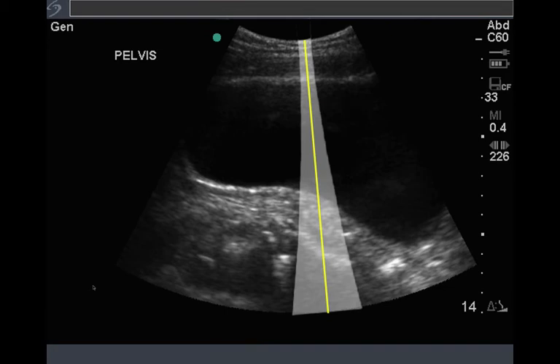So this is a very full bladder, and here the ultrasound machine assumes that the ultrasound beam is a thin line down and all echoes will return from inside that line. But actually the ultrasound beam is thicker, and some of the echoes that return to the ultrasound machine are actually returning from the outside bits of that beam, not from the very center. But the image that the ultrasound machine makes just relates to the central beam, because as you know, there are many individual beams sent down here in a sequence and each one interpreted individually.